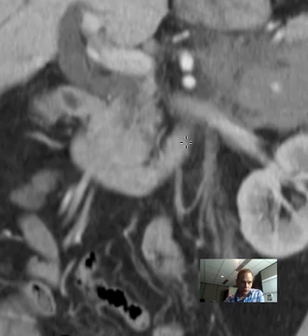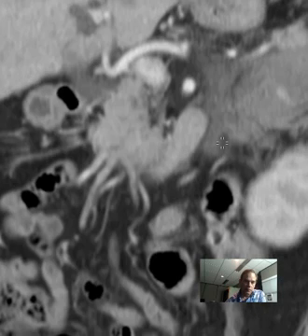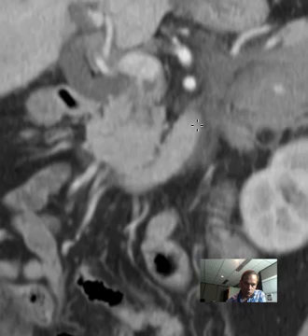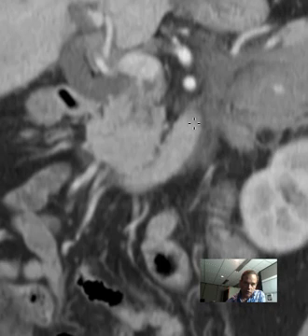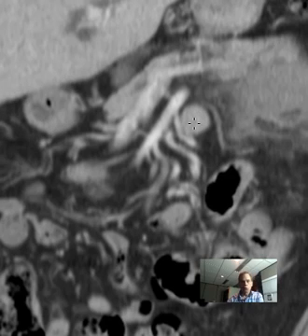So here you have second portion of the duodenum, third portion of the duodenum, and then the fourth portion, you remember, is just a little upward turn like that, beyond which it gets out of the retroperitoneal compartment and moves into the mesentery right here. So it's no longer retroperitoneal. Here it's retroperitoneal. That's why it's fixed like that. Right at this point is the transition where it then is free and mobile in the mesentery, and lo and behold, you have the very proximal jejunum right next to the SMA, which is right next to the SMV.